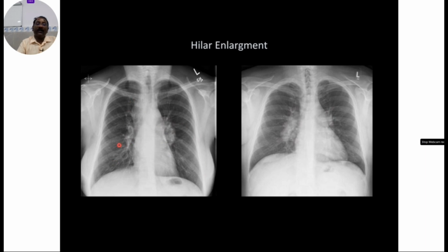So it could be infections only. So what infections? Maybe tuberculous lymphadenopathies or some viral or maybe some sarcoidosis. Okay. So same picture here also. Most likely looks like a sarcoidosis here.